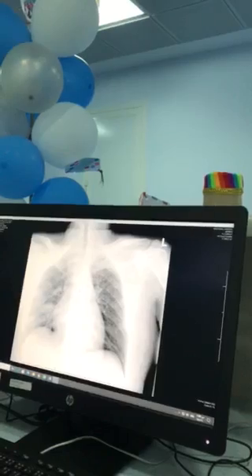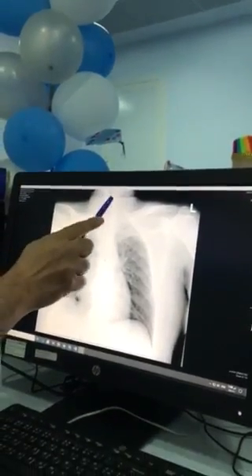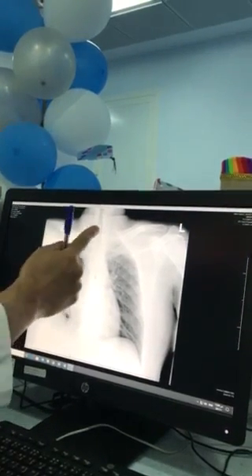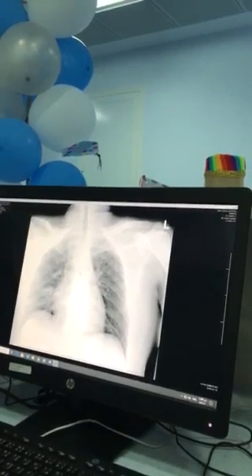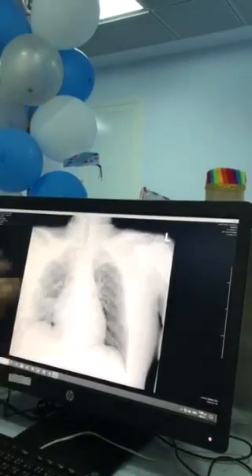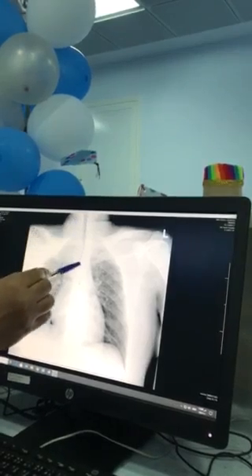Okay, then you will see the trachea. This is central or deviated. Sometimes you will see trachea in the center, which is good. Okay, usually tilted toward the right side. To see trachea a little bit toward the right side, this is normal, which is in this patient. But if you see more deviation toward the right side, then this means there's a problem. Or deviated to the left side, this also means there's a big problem. Okay, so you will see air inside this trachea.